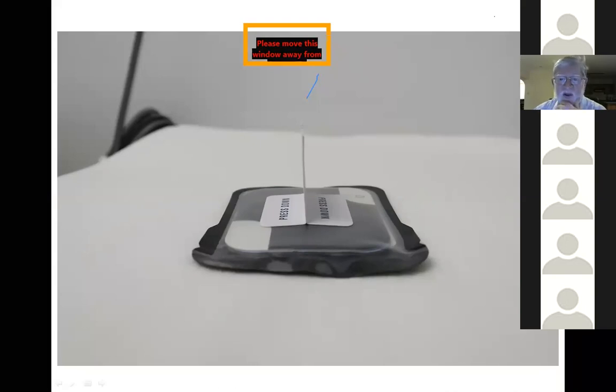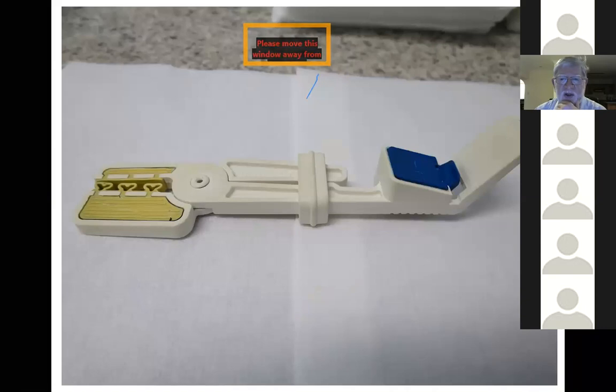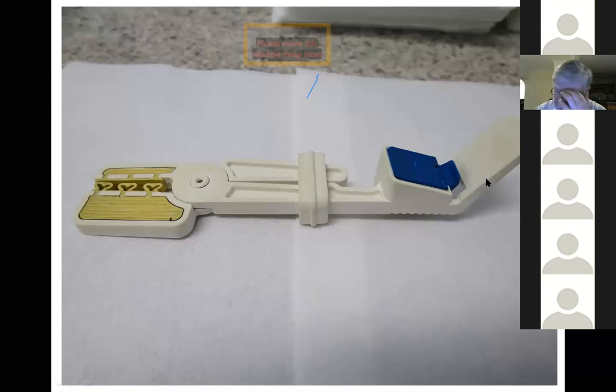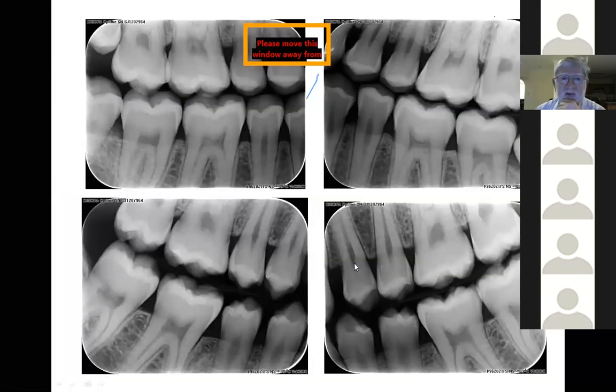So when the patient closes, and I'm using that for all my bite-wing radiographs, the significance of that I'll come to in the following radiographs. And this is the RINN holder that I'll be using for my periapicals, for my posteriors, and for my anteriors. The other term I refer to is the crocodile clip, the RINN X-ray holders. You've got them in dispensary at Griffiths.